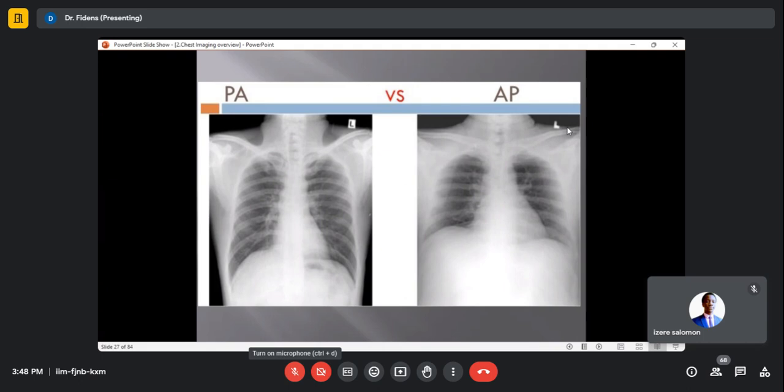And I have seen that the diaphragm becomes like big. Actually, there was no deep inspiration here. I mean, here they are somehow elevated, not big, elevated. They are not depressed because of the inspiration. There was shallow inspiration here compared to this deep inspiration on the PA.